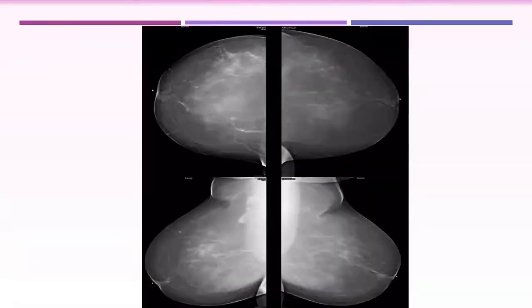Here, bilateral and mild, you even have residual fibrotic ducts. These are fibrotic ducts seen on ultrasound with subsequent mild subtle ductectasia and subtle skin thickening. What about these retractions? Are you confident to say this is just sequelae of ductectasia?